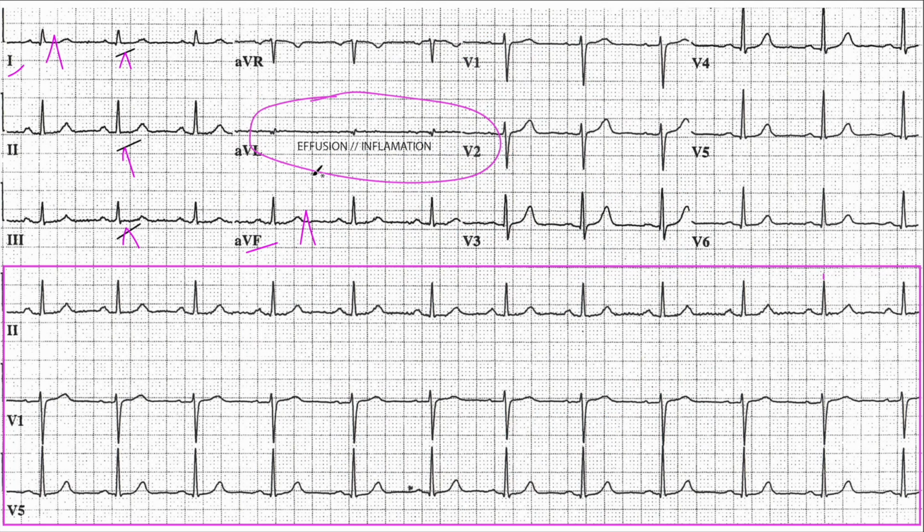Okay, what else? There is another phenomenon here which I am reluctant to discuss because I don't know exactly what's going on with this AVL, but this could be treated as an isoelectric lead. So the signal over here is simply being equaled out.